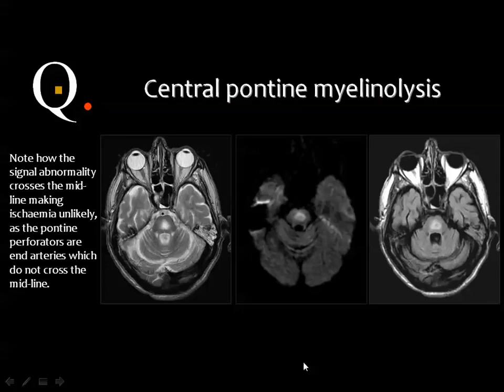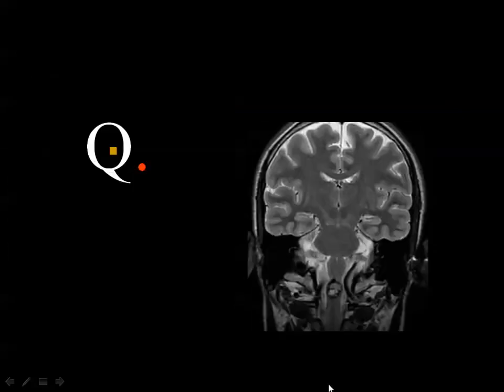I have said just in a moment that central pontine myelinolysis does not show diffusion restriction with few exceptions. Then this is one of the exceptions, where central pontine myelinolysis can show diffusion restriction.